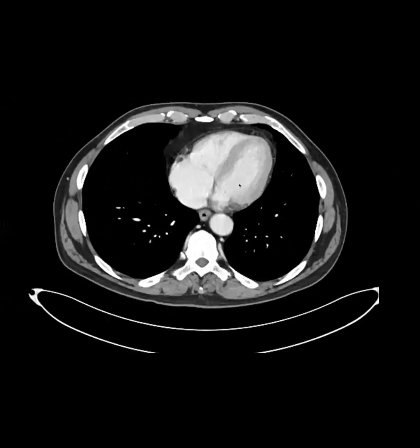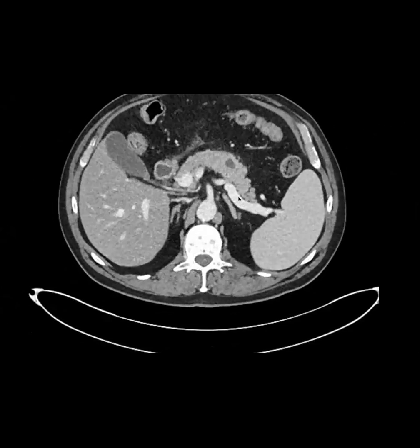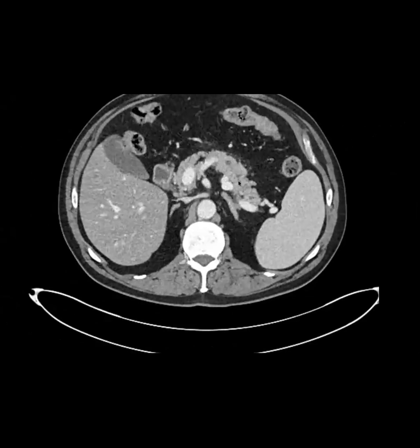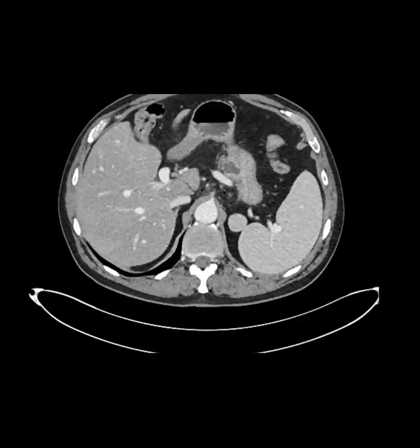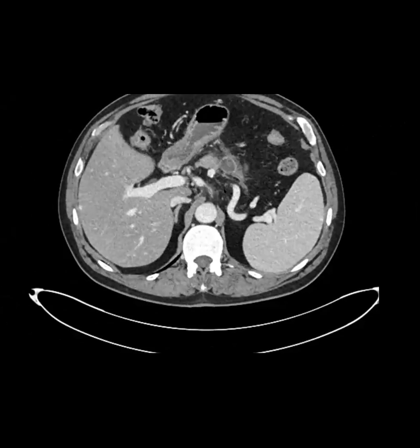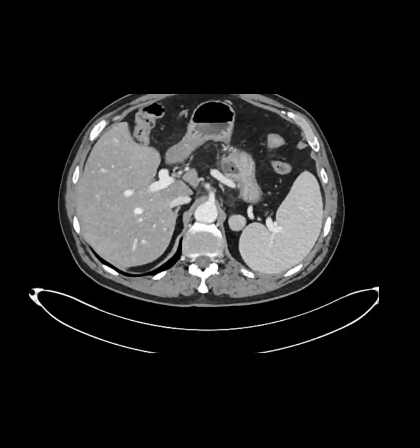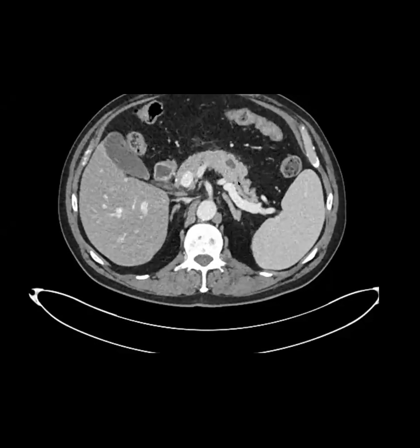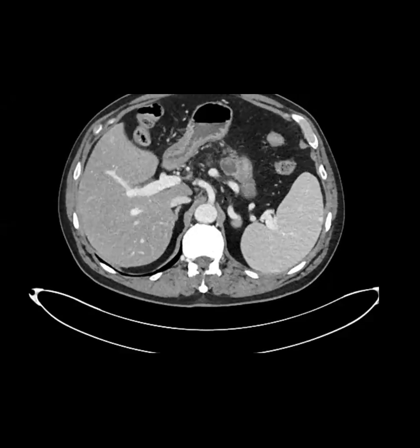Okay, this one is just a really quick one. We can see that the pancreatic duct is dilated in the tail. And then right here, something's happening. We have this fluid-filled structure that's going towards the stomach, and it's insinuating into the gastric wall. My fellow was asking me, is this possibly a gastric ulcer that's going down onto the pancreas? But I was telling him that this is more likely a disrupted pancreatic duct with a fistulous connection that's eroding into the stomach.